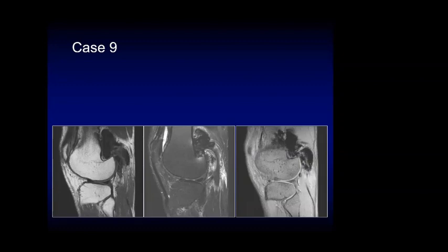So what is unique for the hypointense signal intensity on T1 and T2FS? It may be fibromatous tissue. Fibromatosis is actually a good idea, but I gave you gradient recall echo sequence here.